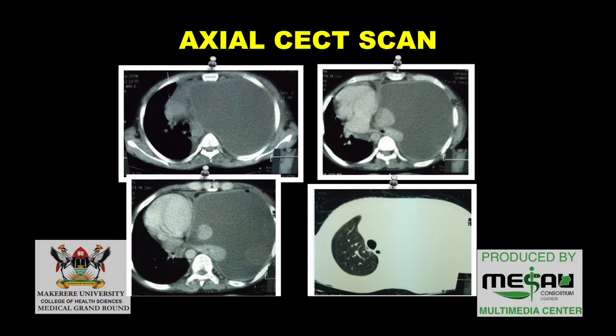These are the different windows that we have, and this is a lung window where we can appreciate the lung markings well. When you look at the fourth CT image, it looks like this other side has nothing. It looks like it's empty. If I had only this without the other images or the X-ray, someone would think this patient had the lung removed. So those were the CT.